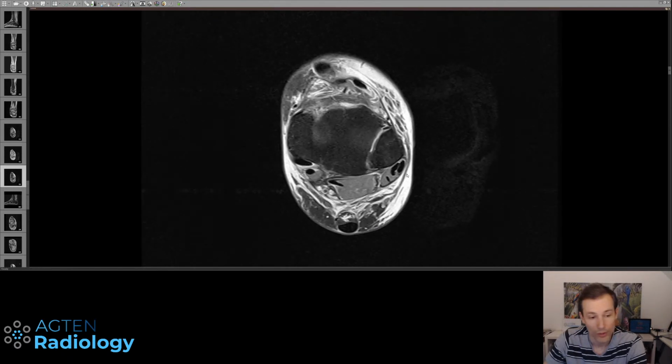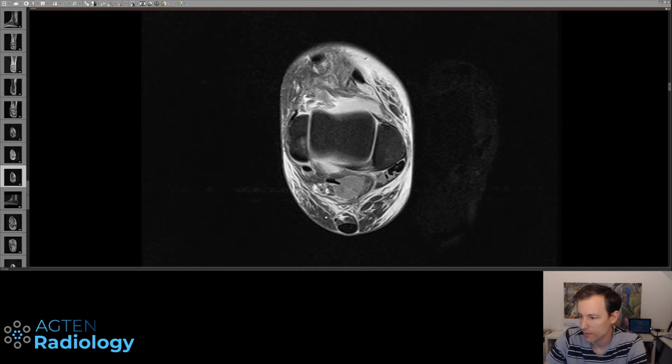And then, very important, the peroneal tendons, obviously. Just let me try where I can chat too, so you can actually see it's live.